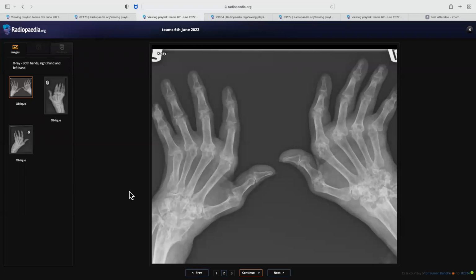Actually, in my first impression, I was having the diagnosis of psoriasis, but reviewing. So what other differentials come to your mind? And why do you think this is psoriasis in the first impression, or later on now, what do you think it is? No, actually the erosions are.